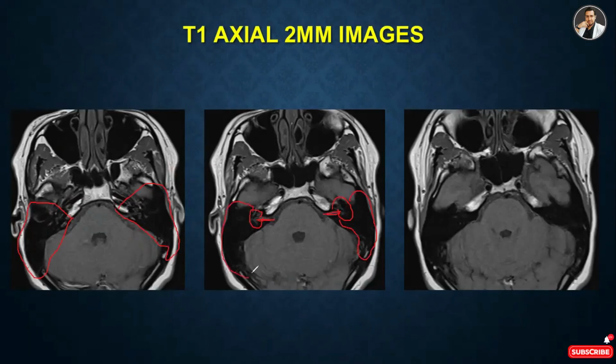So normally, our temporal bone or petrous bone is black. Because this black bone means there is no pathology or infection in our bone. This black bone here is normal. This is our bone, the temporal bone.